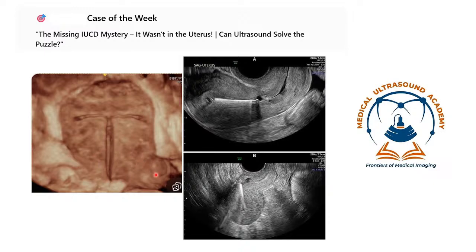That's our uterus there. And if you look at it here, in this longitudinal section, it appears everything is normal on this case. Look at this, look at what is going on there. So let's go deeper into the case presentation.